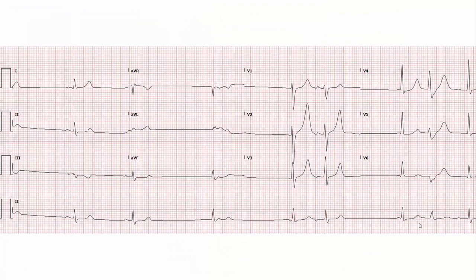Now that you know all of that, let's go back through an example. Upright P wave in lead 2, upright P wave, both of them followed by normal QRS complexes. This is our sinus rhythm pattern, so we have 2 sinus beats. Then we've got a QRS complex followed by a P wave.